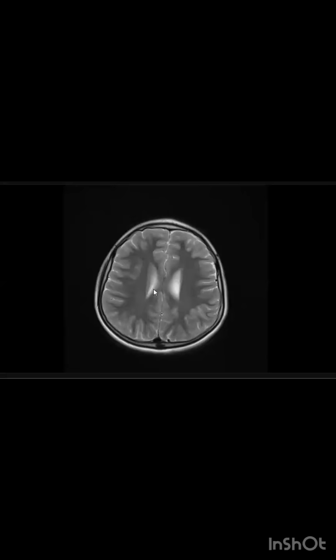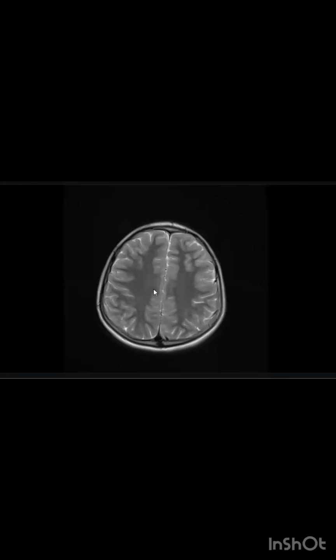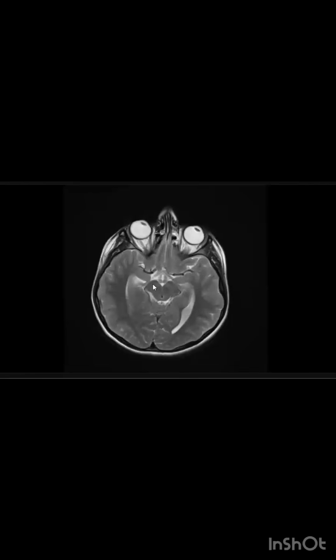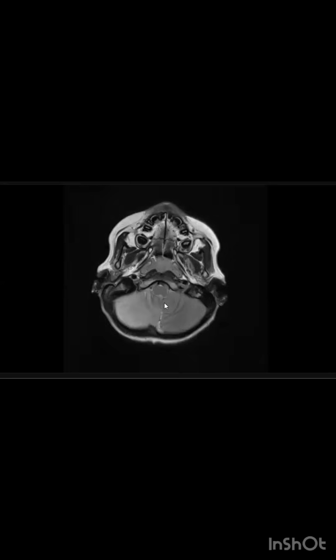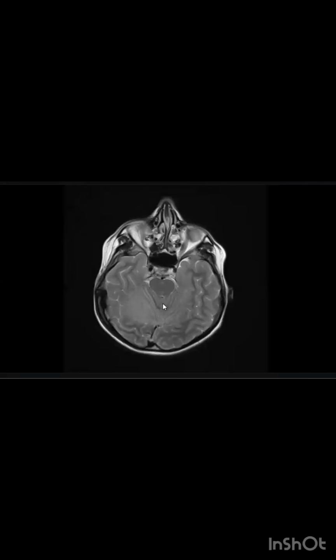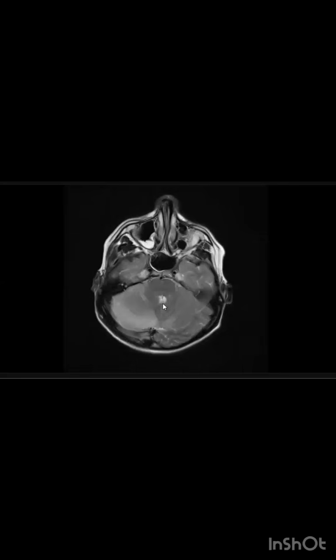Okay. So give me your suspicion. Yeah, my suspicion remains the same: a right posterior inferior cerebellar artery infarct, and for this the patient needs urgent CT angiography. Will the infarct preserve the folia? And anything else? The infarct can cause cytotoxic edema.